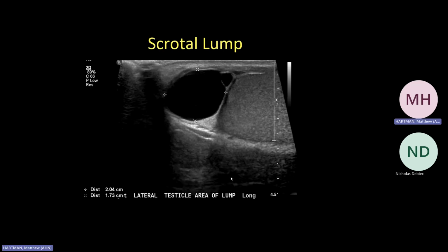Okay, let's put this to work. A patient comes in with a lump in the scrotum. We see a lesion. Is it solid or cystic? Well, remembering our basic RadPath, this is anechoic. There's some positive through transmission. This is cystic. This is the testicle up here. This is superior, extratesticular, in the epididymis. We just diagnosed an epididymal cyst, benign.